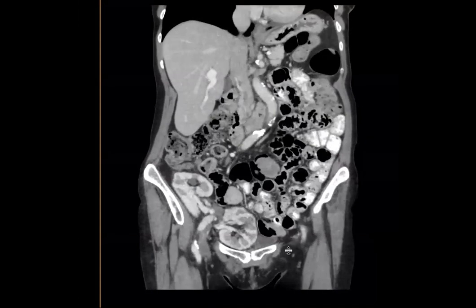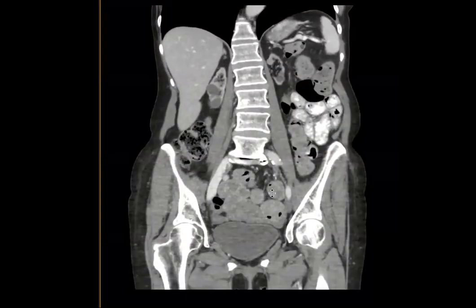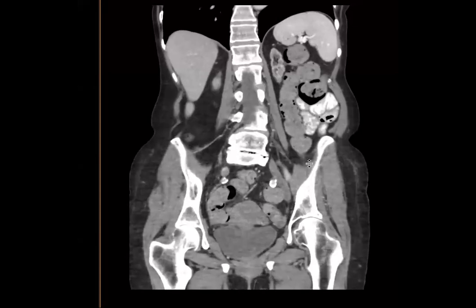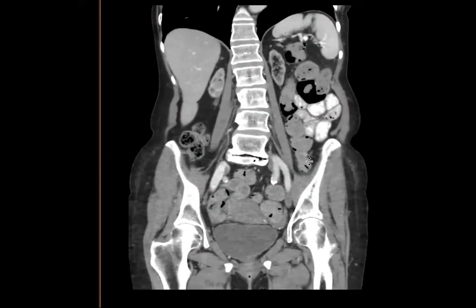Is this a horseshoe? Is this an ectopic? And I'm going to show you the region of the native kidneys, because they look like they communicated. Look at the retroperitoneum and where the native kidneys should be. Yeah. So they're very atrophic and small, calcified.